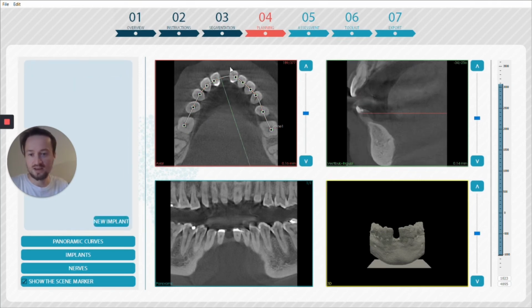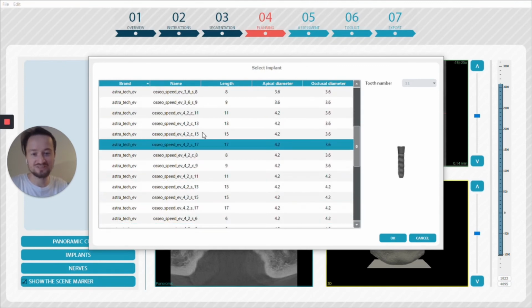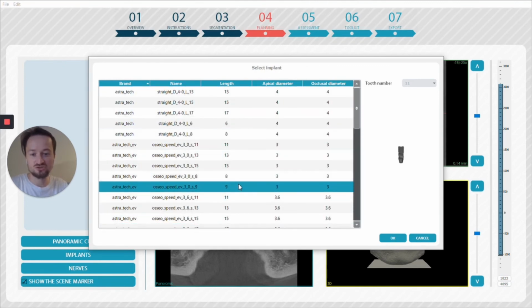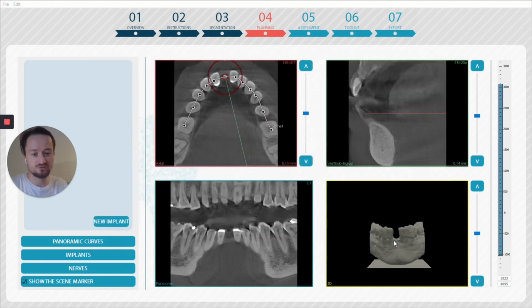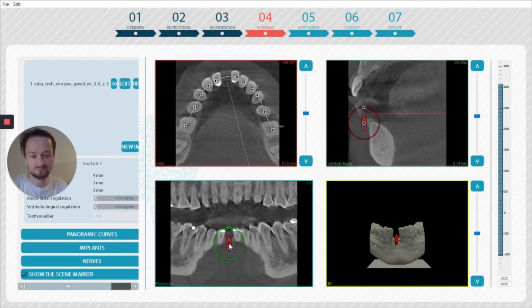So then from that, like before, you can click the middle and drag it down. And with the 3D view, you can see exactly what's going on as well. So then here you can drag it across. The one at the top of the gizmo allows you to rotate, and as you bring it out, you can just check your position and make sure it's well placed.